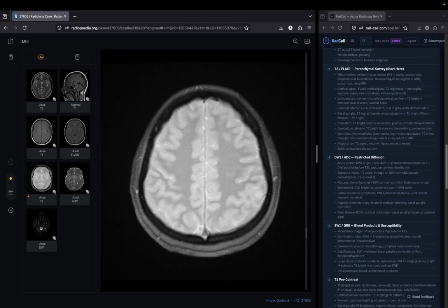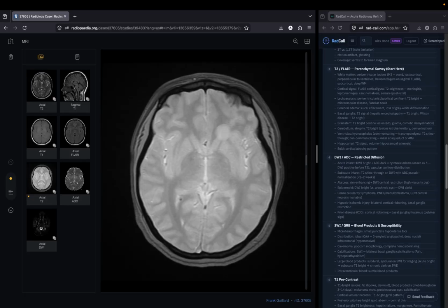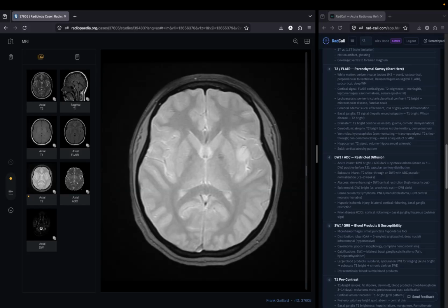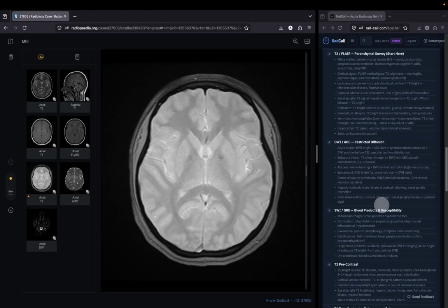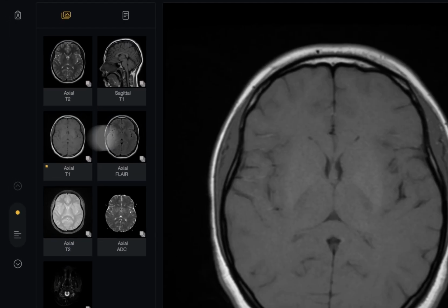Also, bleeding structures that have bled in the past, like little cavernomas, can also show up best here on the GRE or the SWI, as well as any blood products. So that's your SWI or GRE. Next, you'll move on to your T1 sequences.